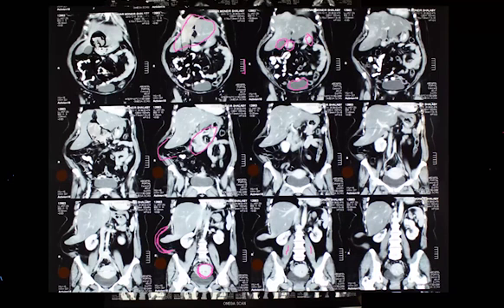A hernia. You can see the difference in the parietes. Exactly. I was telling you to note that in the parietes there are muscles on the left-hand side, but on the right-hand side the muscles are not there. There are no muscles, only a very thin muscle that you can see. Can you see it? Can you see the skin? Point to the skin. There's a very small part of the skin shown on both sides.